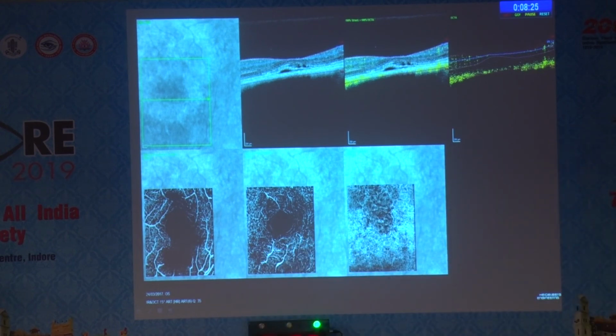Actually, you're not giving us any history. This is basically an imaging symposium, so it's fine. I'm allowed to do that. Pretty unfair. My question is, if there was a CNV, why was it not picked up on ICG? I always wondered why these small CNVs are not picked up on ICG. That's a really nice question.